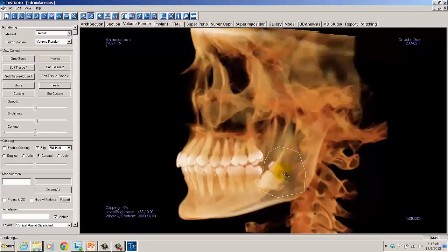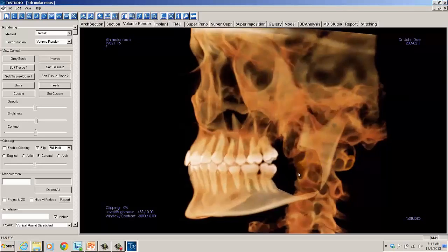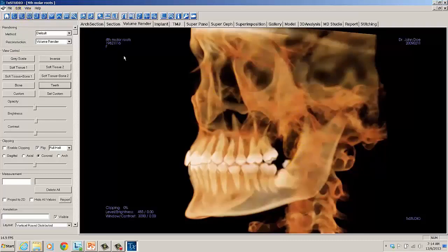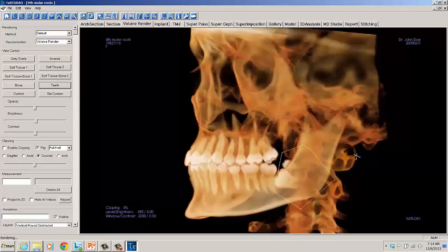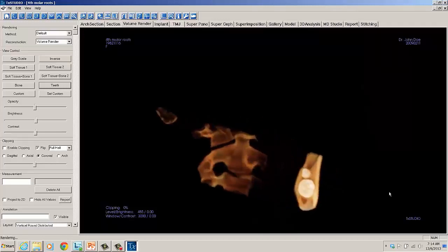Then put your scissors in the middle of the polygon, left mouse click, and we remove that whole area. Now if we did not want to remove the area, if we wanted to remove everything else, then we can click on our undo and simply click on our polygon tool again. Let's draw our polygon, and let's left mouse click outside of that polygon with our scissors. We can do further sculpting here if we'd like.